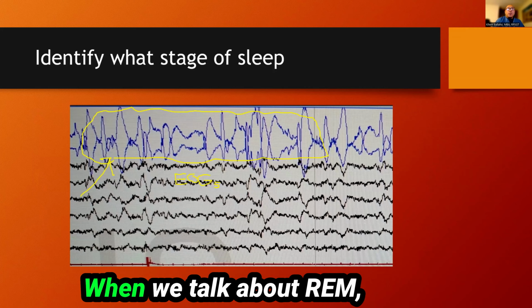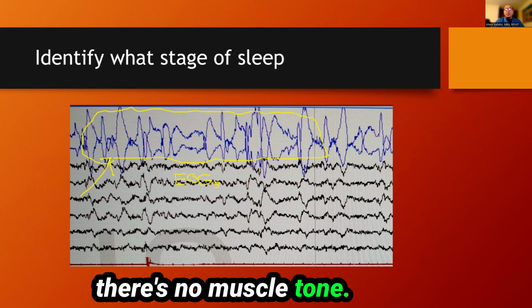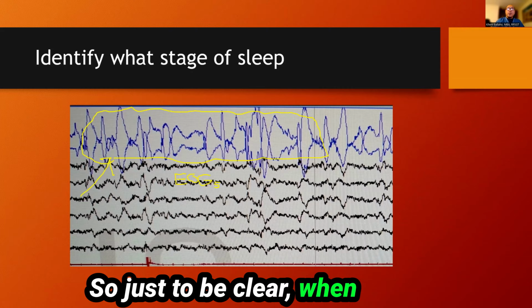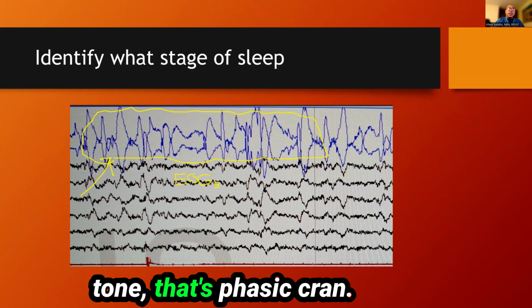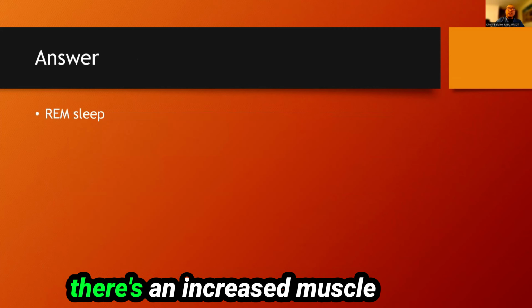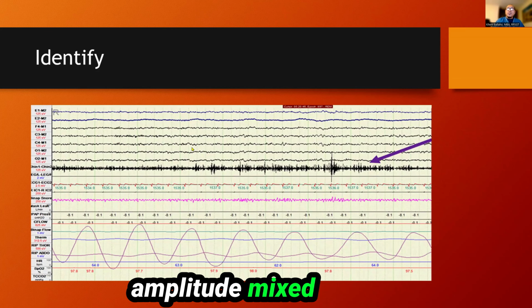Okay. When we talk about REM, we usually say, I know it's REM because there's no muscle tone. Not all the time. Okay. So just to be clear, when you see eye movement and then there's no muscle tone, that's phasic REM. But if you see very little eye movement and then there's an increased muscle tone, but yet it's very quiet, see, this is all low amplitude mixed frequency.